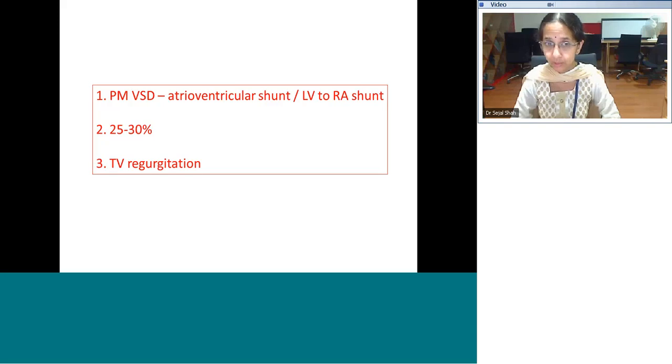And for the surgeons, tricuspid regurgitation residual post-operatively. Yes, surgical patch, part of repair through the tricuspid valve. So residual tricuspid valve regurgitation possibilities are higher compared to usual membranous VSDs. Yes. So now we will go to our 5th case.